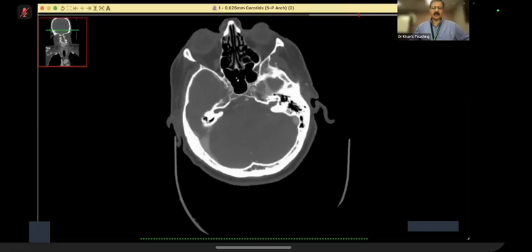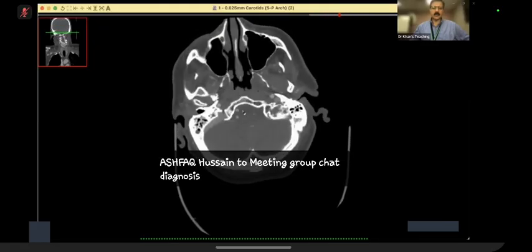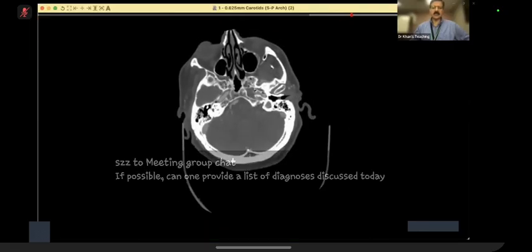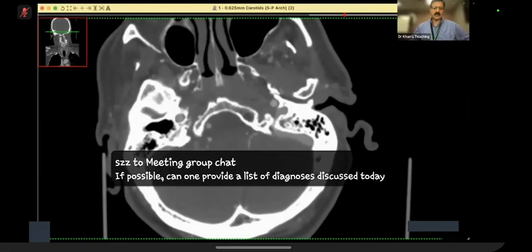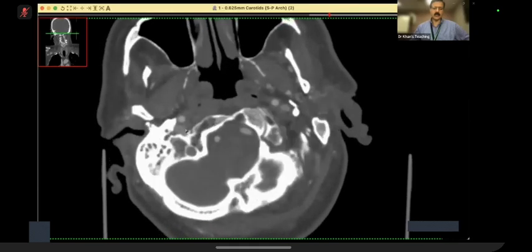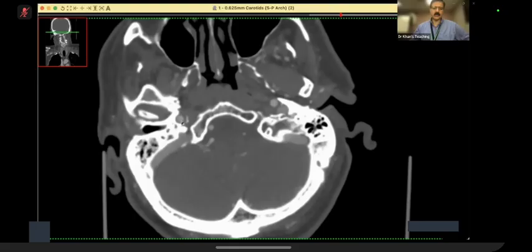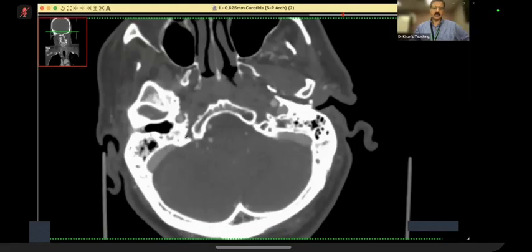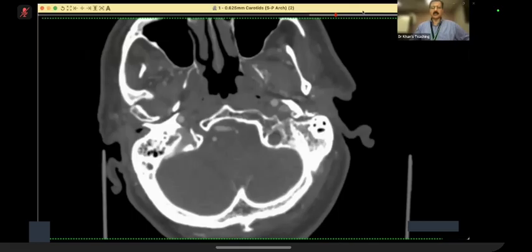And this is a venogram type of study, normal, just to tell you what happens regarding the vessels. You see, this is the carotid canal where the carotid artery is. This is the transverse sinus, the sigmoid sinus. It goes down. So this is the jugular foramen. And do you see this is the carotid artery? And then the carotid artery, the vertical part, goes into this carotid canal, goes anteriorly. And the jugular foramen is slightly more inferiorly. Okay, next, please.